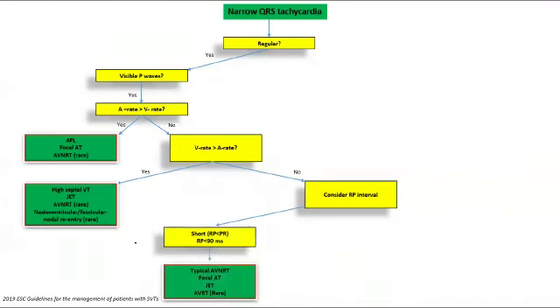For instance, if you have a short RP tachycardia, meaning an RP interval shorter than the PR interval, and your RP interval when you measure it is less than 90 milliseconds. There isn't really much strong data to support the 90, but it's a value that we use. If you were to take the patient to the EP lab and do some pacing and measurements, we usually take a V to A time of less than 70 milliseconds.